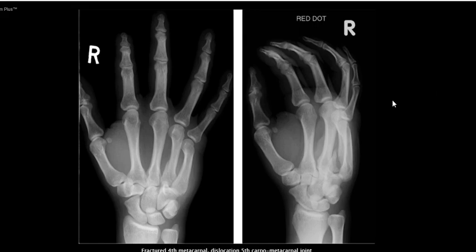In general, the projections used for this hand X-ray, we have here the DP and the oblique. These are usually seen as sufficient to demonstrate these kinds of injuries. However, in practice, it's very common to also obtain a lateral view of the hand for these kinds of injuries of the metacarpals to see the displacement of the bones for any kind of therapy that the patient will receive in ED or fracture clinic follow-up, and can also be for surgery.